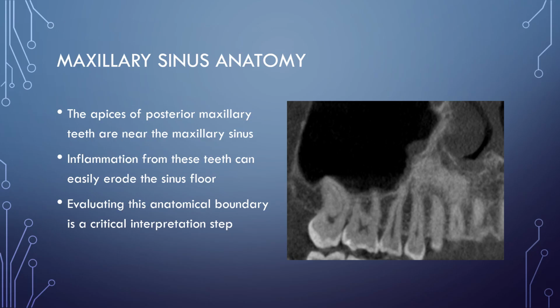During your radiographic assessment, you must carefully scroll through the sagittal and coronal planes to inspect the integrity of this bony floor. Recognizing this anatomical proximity is the crucial first step before you can accurately identify any subsequent sinus membrane inflammation caused by an infected tooth.